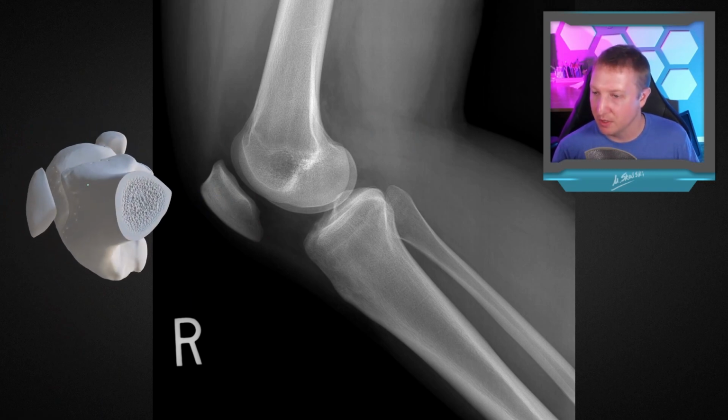Oh, and I just wanted to point out again here at the patellofemoral joint, this is why we're seeing the median patellar ridge project deep to the edge of the other medial and lateral facets, giving us these multiple cortical lines here. And then similarly, we see the cortical line from the center of our trochlear groove like that, and then we'll see the condyles projecting a bit more anterior.